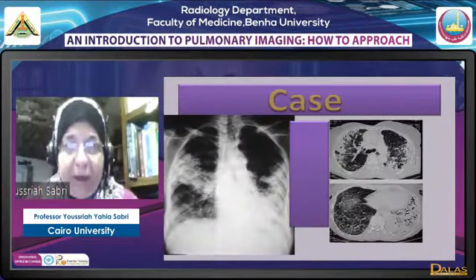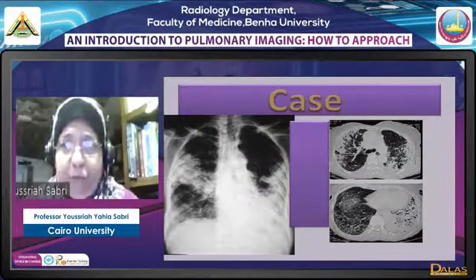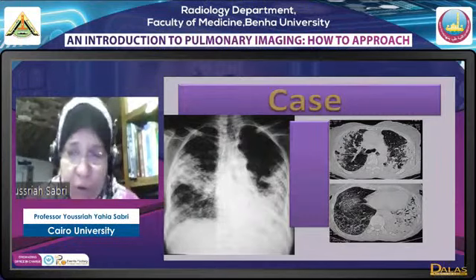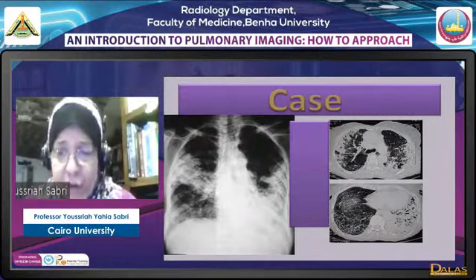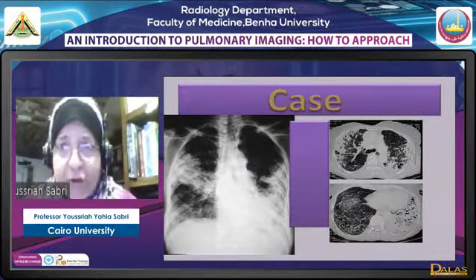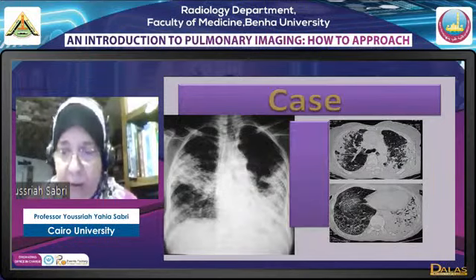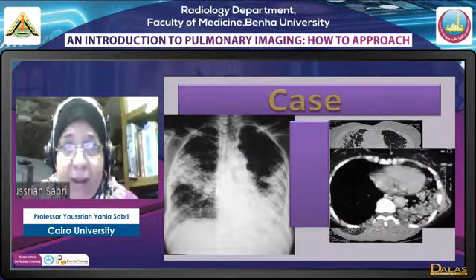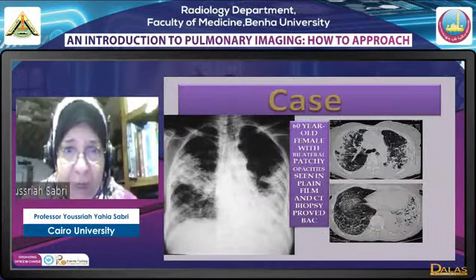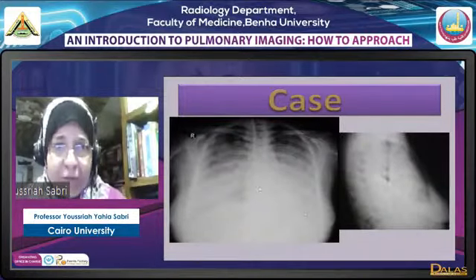Now, here another case. This was an elderly patient that was diagnosed for months as bronchopneumonia, and then finally they decided to take a biopsy, which at that time was diagnosed as bronchoalveolar carcinoma. Of course, you all know that this terminology is no more in use, and this is one pattern of adenocarcinoma in the lung. Okay, and this patient is a 60-year-old female with patchy opacities seen, as you can see, and this is a very common history, by the way, this follow-up of pneumonia for months.